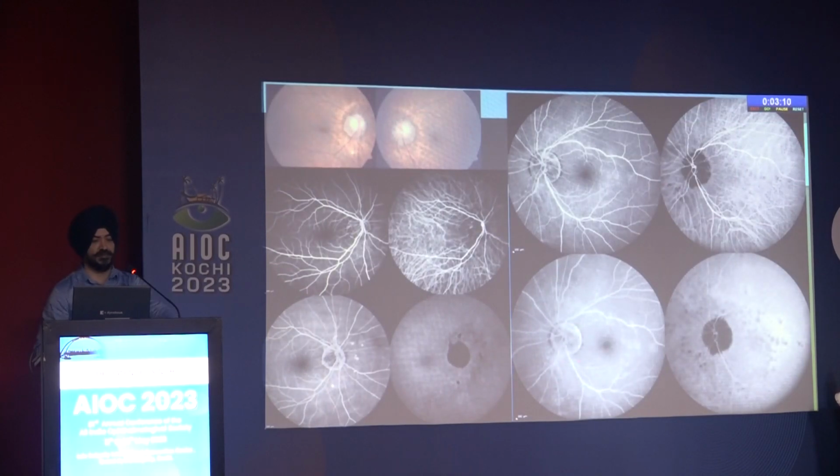This is a patient with myopia. Again, you can see some lesions in the right eye around the disc, some amount of parapapillary atrophy. On the left eye angiogram, you can see fluorescein angiography not providing much information, but the lesion around the disc with some amount of satellite lesions spreading across the posterior pole gives a diagnosis of MEWDS, multiple evanescent white dot syndrome.